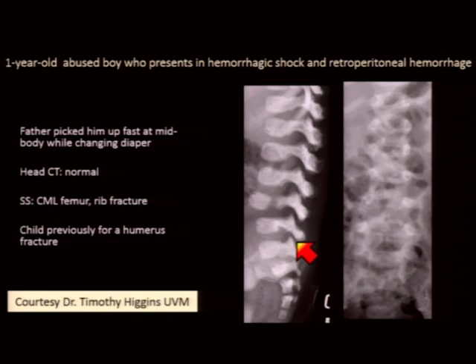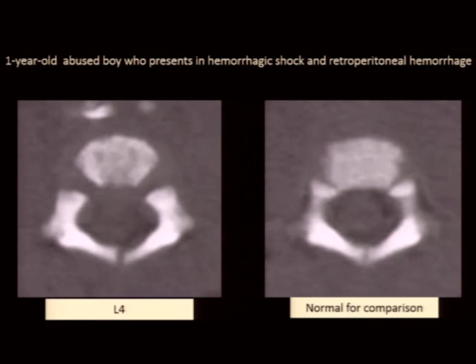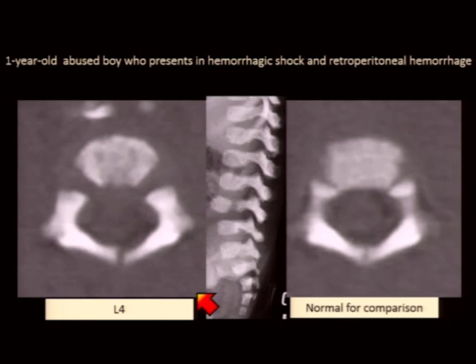So again, on the axial images, you can see what kind of injury this is. It's a fracture through both neurocentral synchondroses and the posterior synchondrosis with anterior displacement of the vertebral body. Looking again here, now you can see that these are the neural arches superimposed with the dissociated vertebral body displaced anteriorly. And in the literature, this has been termed a wandering vertebral body.